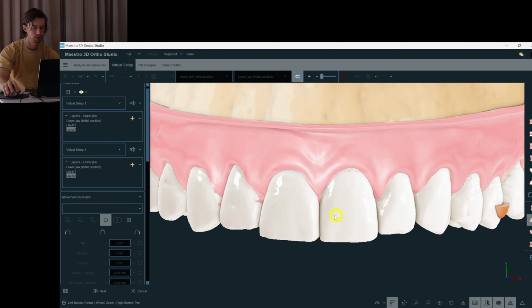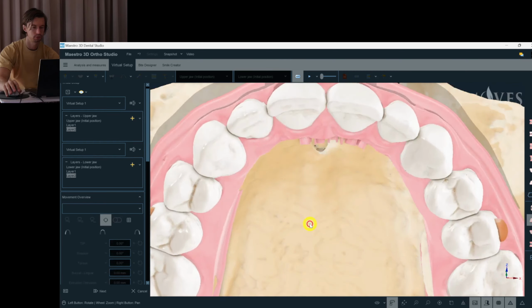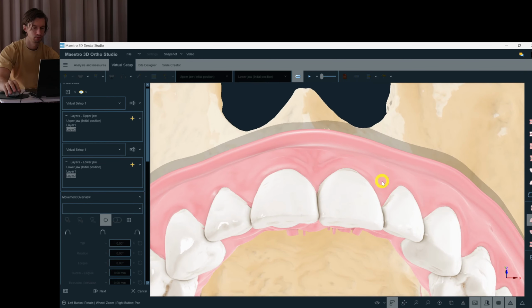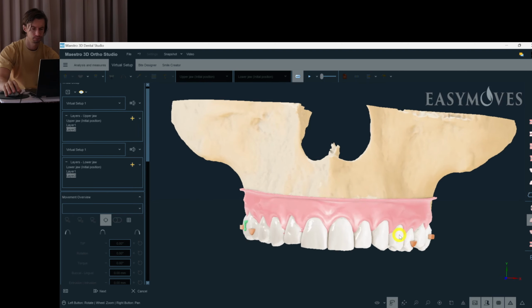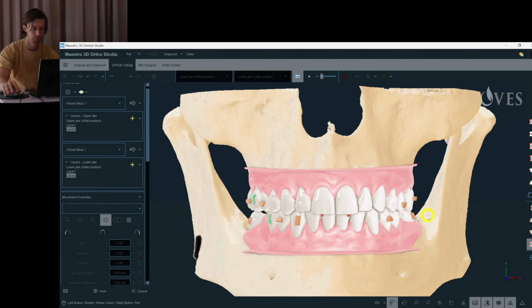Should we line the incisors so that their incisal edges are at the same level? We'll show it to the doctor if they're going to make some prosthetics, I don't know, or maybe they just grind them to make them look more even.